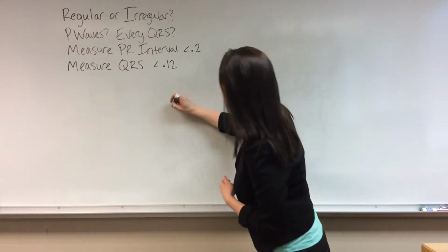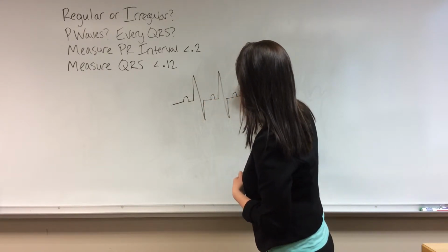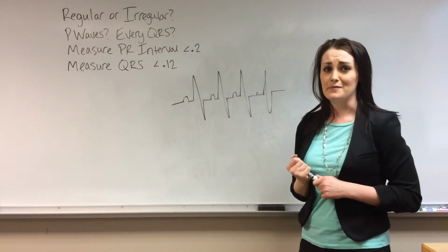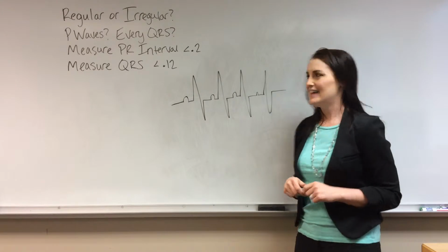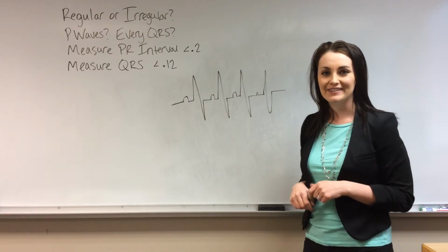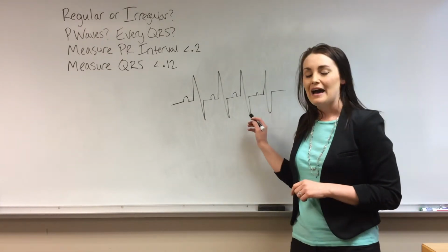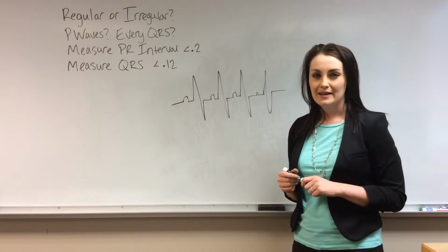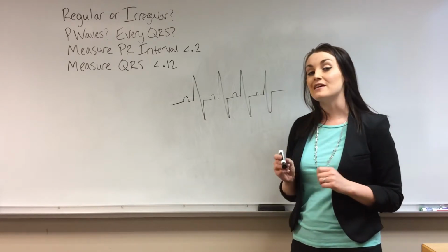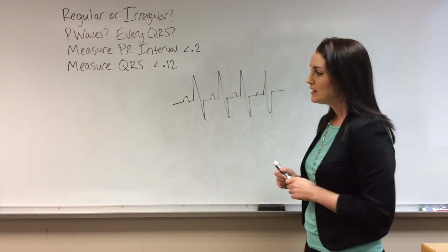So, the next one. So you might be thinking, this looks really normal, and maybe it is, and wow, I go through all my steps and everything looks great, so why is it being included right in this part of the lecture? And that's because just because you have a cardiac rhythm on your monitor does not mean that there's mechanical capture, okay? And this lends to the importance of assessing your patient along with your cardiac rhythm, your monitor.